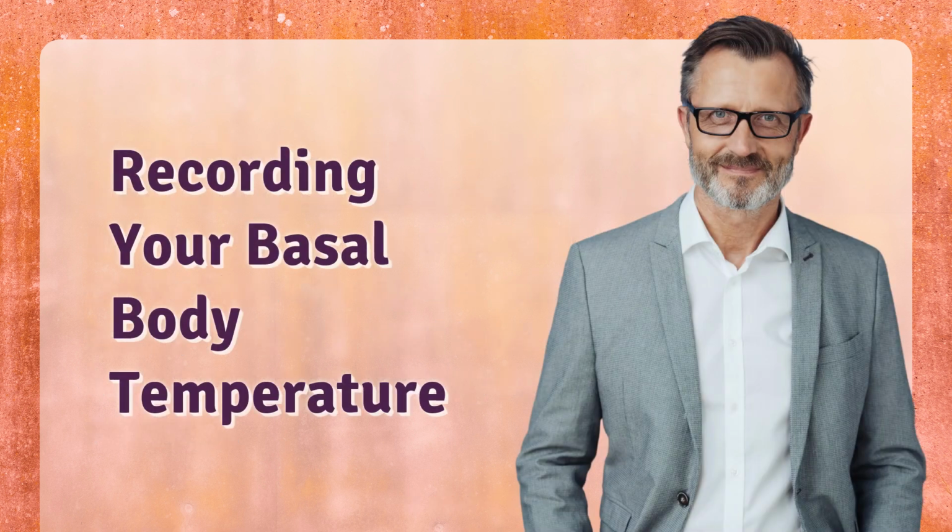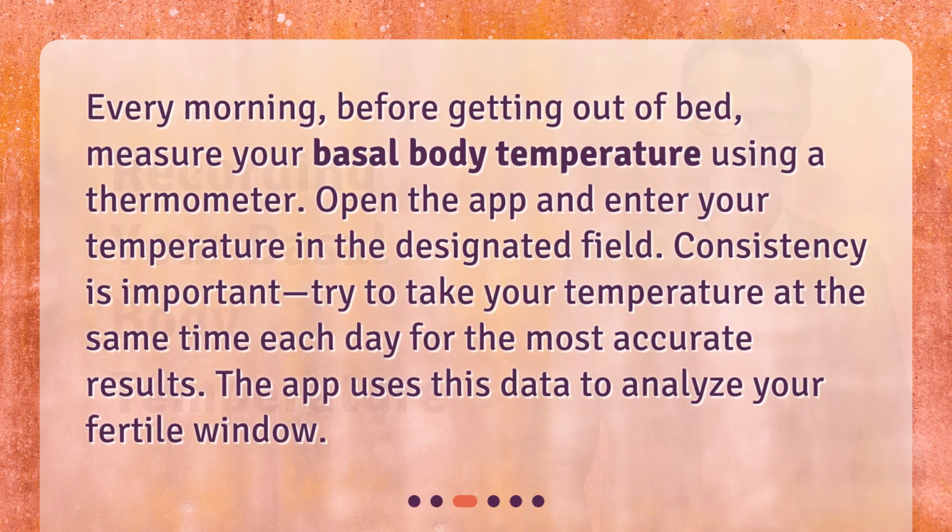Recording your basal body temperature. Every morning, before getting out of bed, measure your basal body temperature using a thermometer. Open the app and enter your temperature in the designated field. Consistency is important. Try to take your temperature at the same time each day for the most accurate results. The app uses this data to analyze your fertile window.